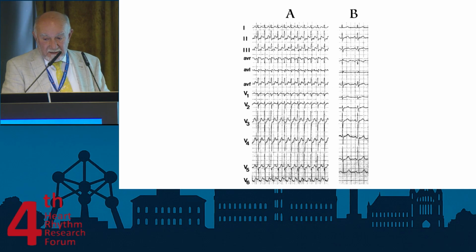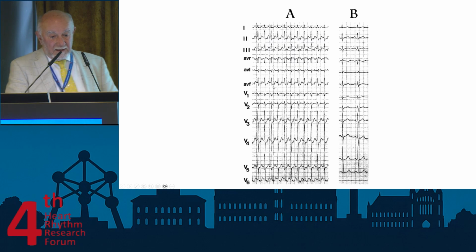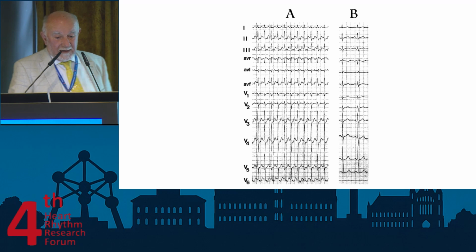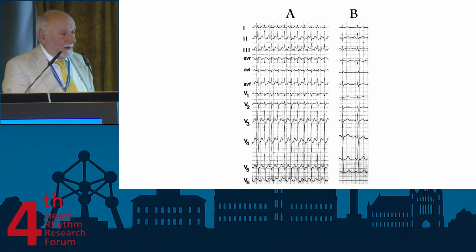Atrial tachycardia, slow AV nodal reentrant tachycardia, circus movement tachycardia over an accessory pathway, or typical AV nodal reentrant tachycardia. Look at this. So what do we see? Tachycardia with a narrow QRS complex and a very sharp negative wave in the middle between the QRS complexes.